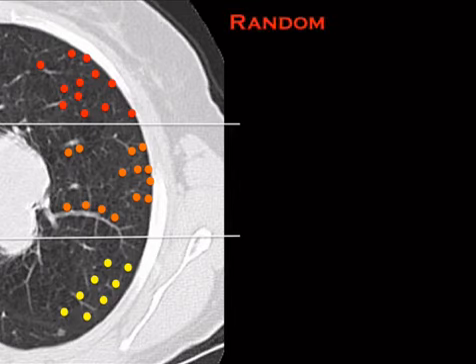So random nodules will involve the pleura, but they will not be as evenly spaced, and they will not clearly be involving a perilymphatic, peribronchovascular distribution, as opposed to this here, where you can clearly see the nodules are along this peribronchovascular pathway, and they're involving the pleura.